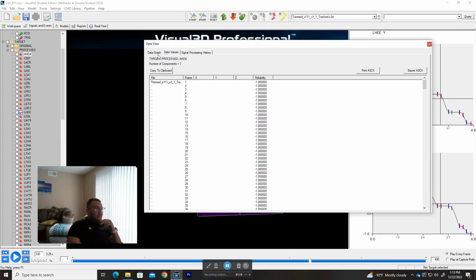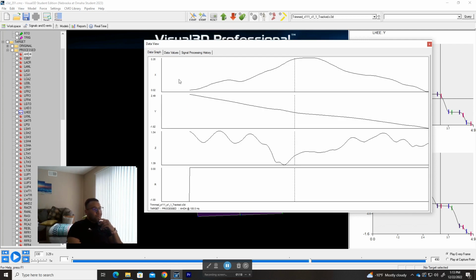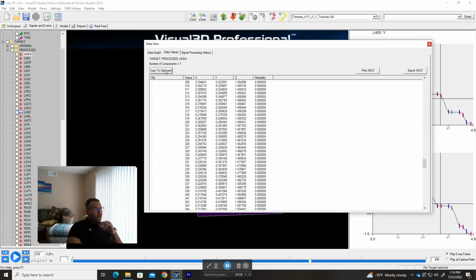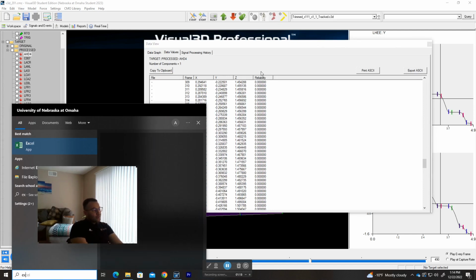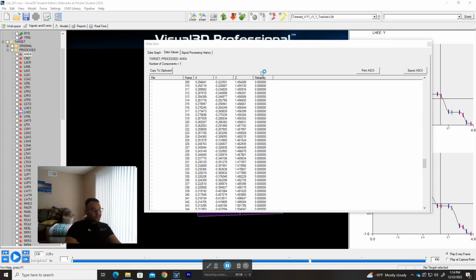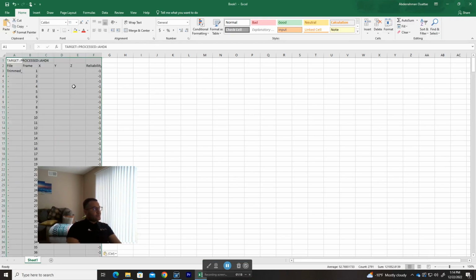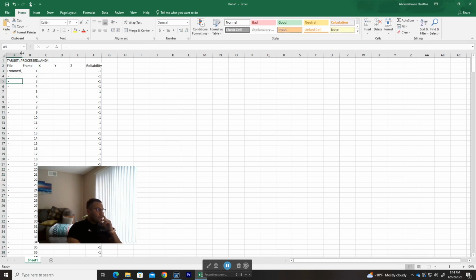The next thing here is that although there is a pipeline that exports all the data for you in a very organized fashion, we'll go through that in a little bit. But you can also, for example, if you just want to use this data, copy it to clipboard, and then open a new Excel sheet and just save it here. So once you save it, it gives you the target, so the actual name of that outcome measure you're using.